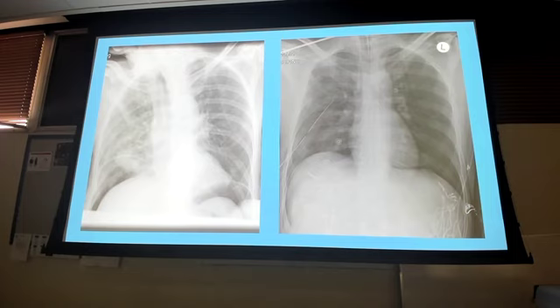What do we got going on, the primary thing in this one that stands out? Pneumoperitoneum. Yes, there's a lot of other stuff going on in here, right? But I'm rotated, so this gives me questions because this is a patient who's in a hospital bed. But definitely a pneumoperitoneum stands out.